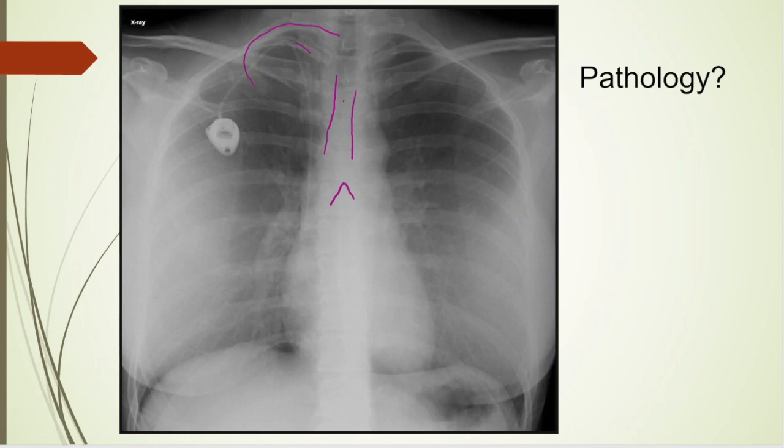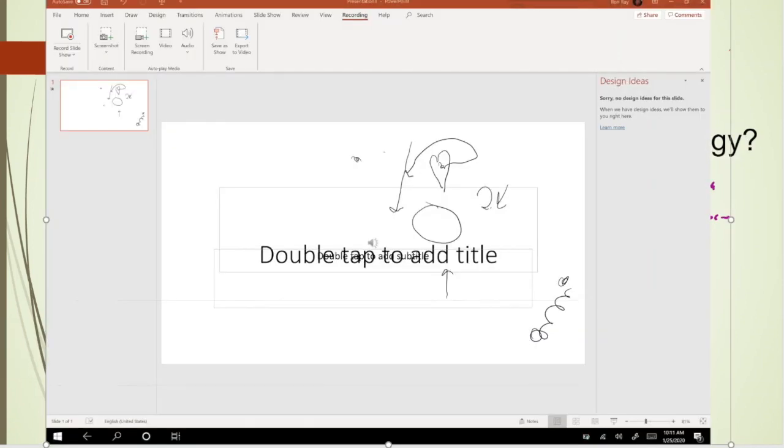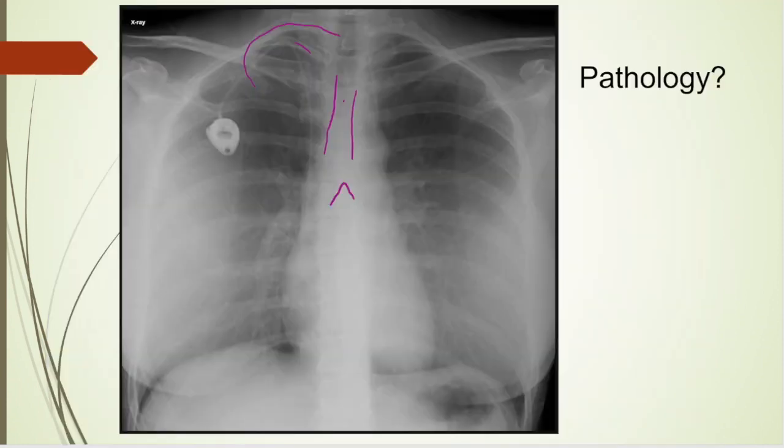A little hard to see down below. Oh, doggone it, keep hitting it. My big hands. So let's see, back to here. Here's first rib, so that's T1 here. T2, looks like T3. So 1, 2, 3. Here's fourth ribs. This would be T4, T5. Looks like that's the end of it. Looks like this is T6. So, yes, I think we're right. I think that's carina right there.